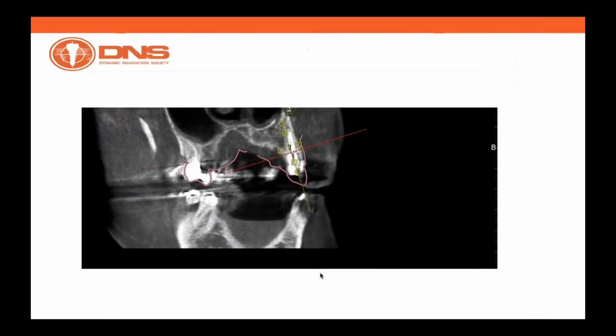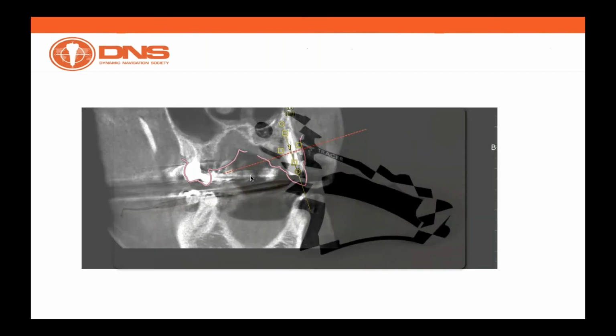Again, this is equally quite a compelling picture of what we're talking about in terms of artifacts and scatter, and how it hinders the possibility to draw a significant amount of data from the single crown.